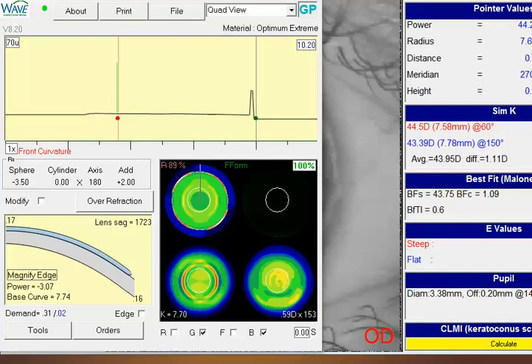I see from your request you're struggling with a couple different issues. The first is it sounds like you may have mislocated your wave design. Easiest way to relocate that lens, if you can't find it on your computer, is to open up the Wave software off your desktop denoted by the W icon. If you double click on that, it'll open up.